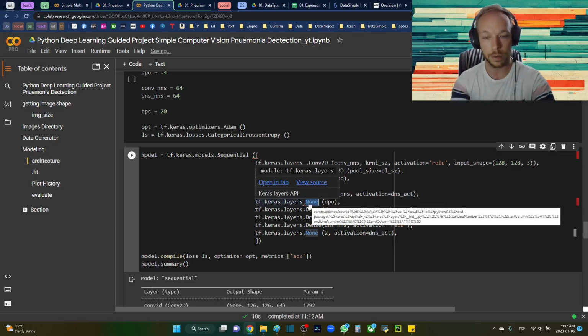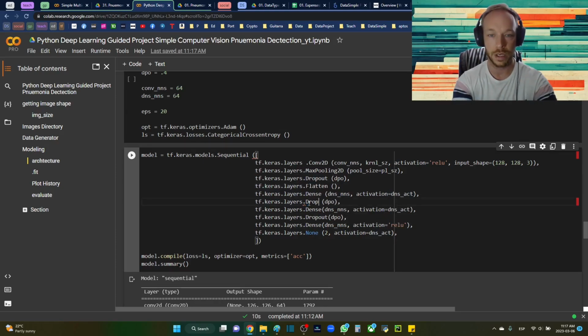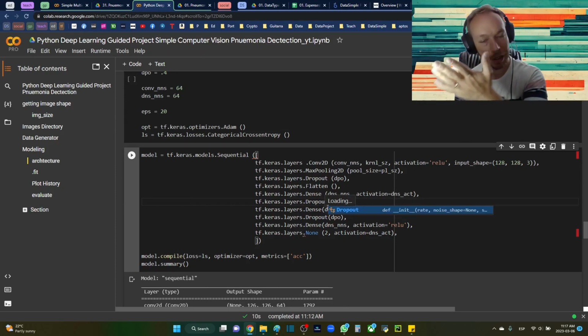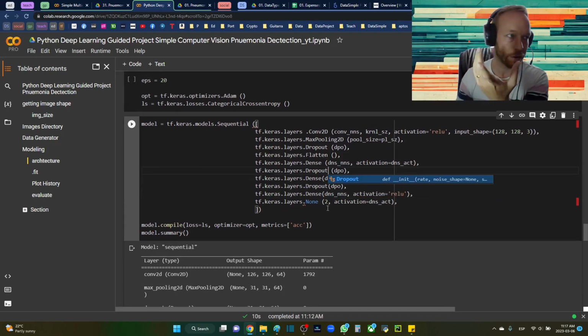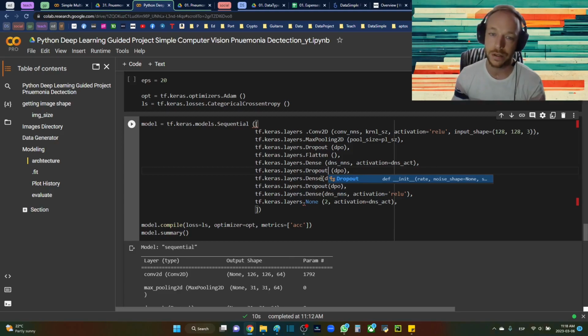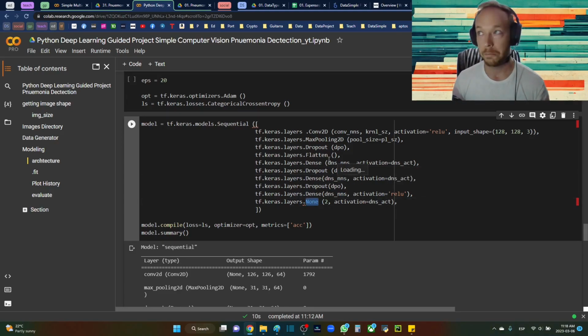Do another dropout layer. It's really good to just do dropout layers between dense layers especially. It feels like they just get clunky, like stuck going through one path very, very easily. So if you see dense layers, it's really good to do these dropouts. But really, dropouts are super important in lots of places in your network.